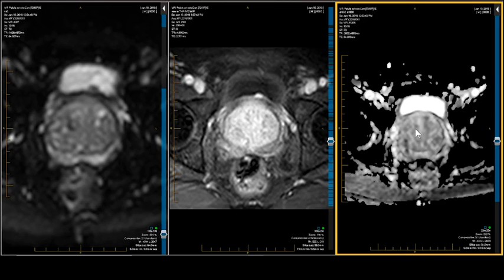And you can get those from biopsy, from old blood, from fibrous tissue, from it being very firm and desmoplastic, but it's tiny. And generally, our detection for prostate cancer is at about 2 to 3 millimeters is our lower threshold. So this is an example of a PIRADS 2, which we'll discuss a little bit later on, but it's an example of a BPH lobar type 2 BPH. Let's move on, shall we?